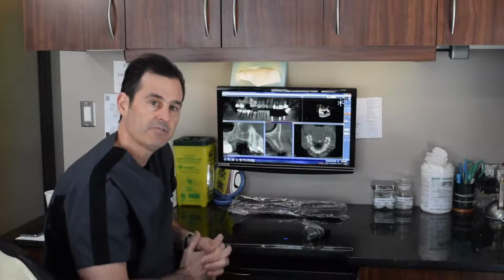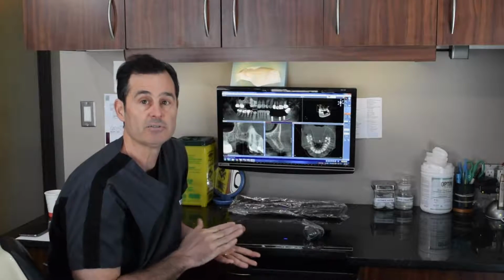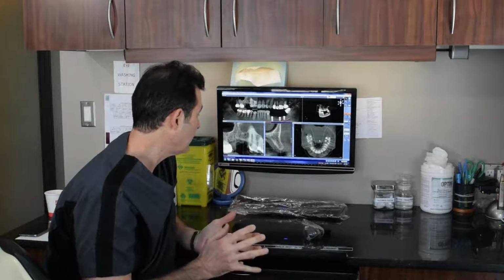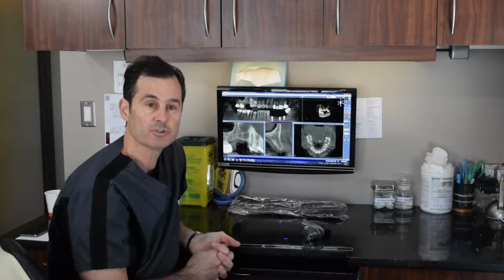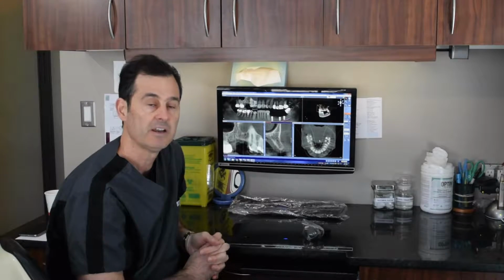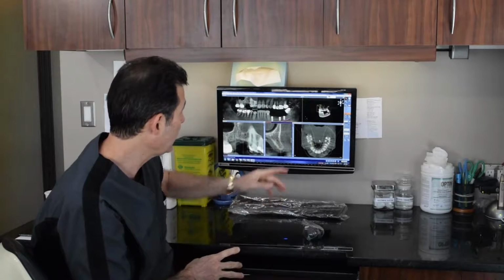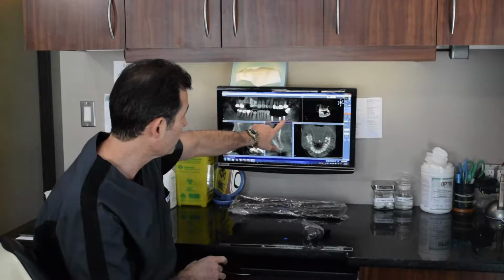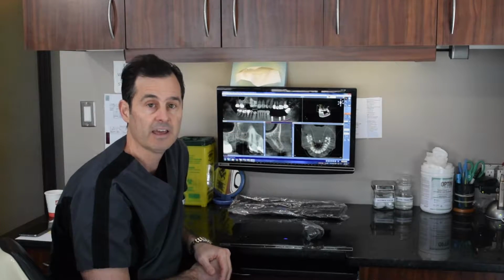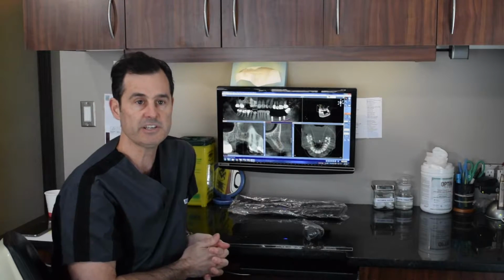So this is the kind of information that our CT scans allow us to see in advance, that I don't have enough bone or I do have enough bone. So here I've showed you two different cases. The first one had tons and tons of bone, easy case we can put the implants into. This one is very lacking in bone, it's going to need some bone reconstruction, and it's high risk that we could hit the nerve here. So again, this surgery is going to require a little bit more care and a little bit higher risk. So those are the kinds of things that we use our CT scanner for.